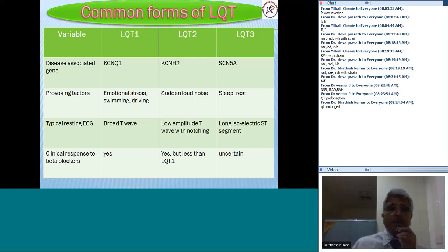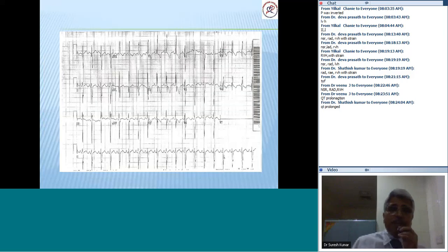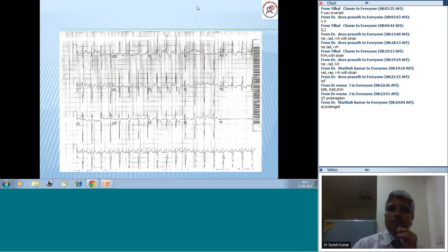This is something totally different. Have a look at this. Something simple. I want you to give me the diagnosis.